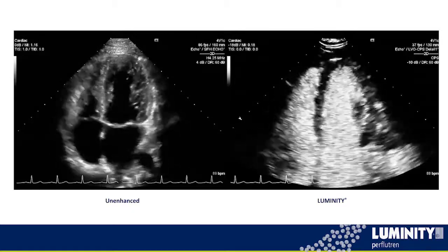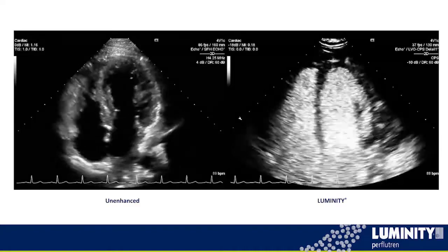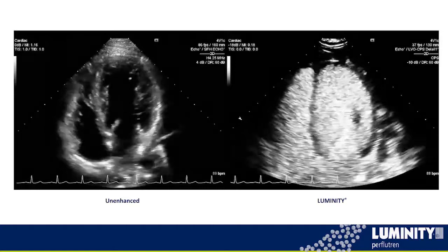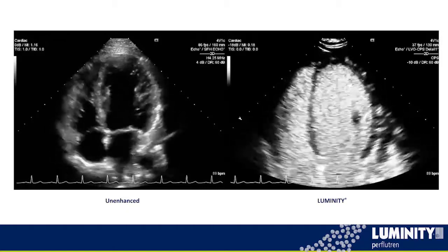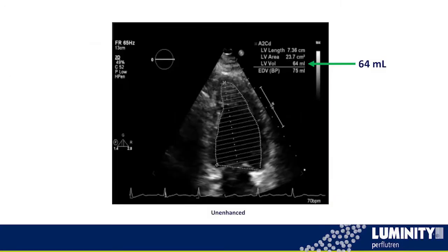We look at the image on the right-hand side, you can clearly see the endocardial border, right? And we could be much more consistent on these patients, which really plays a huge role, especially in those oncology patients that we see growing and growing in the echo lab. This is an example of just how much we do underestimate the volumes in patients.